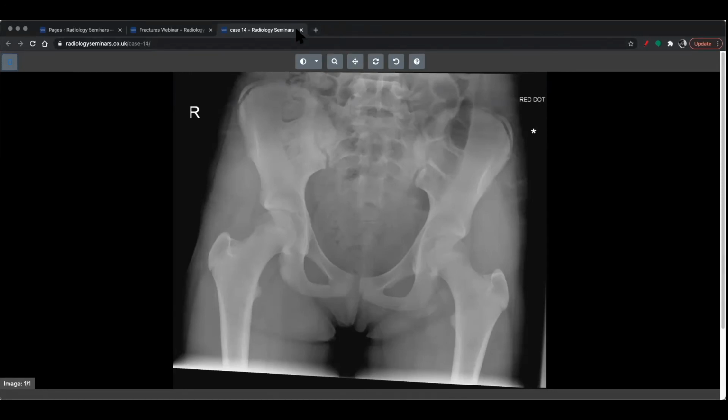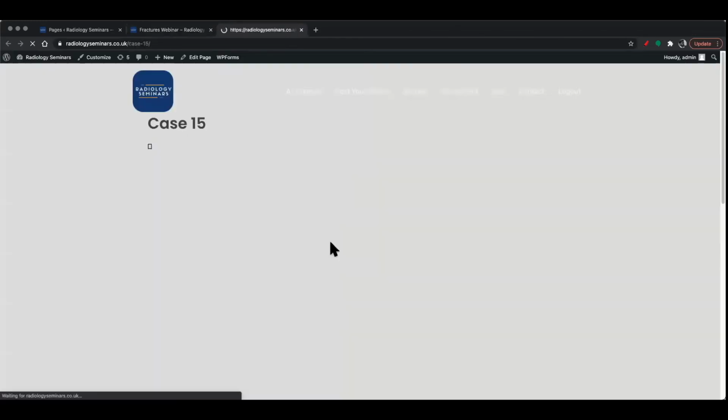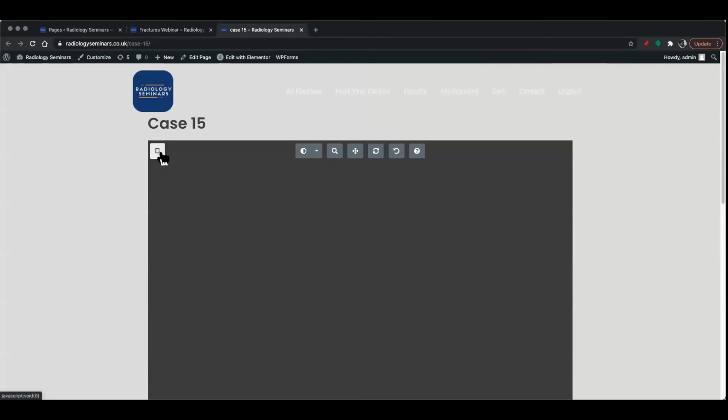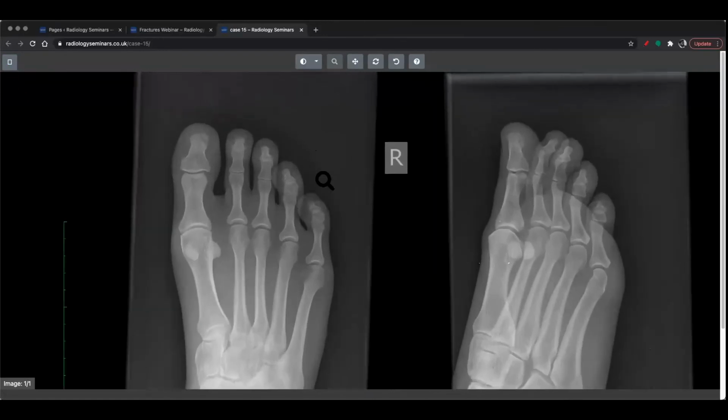So this is something that can happen to very young people, and so just something to be aware of. Look at those normal, very high yield areas: anterior inferior iliac spine, anterior superior iliac spine, and then look at the ischial tuberosity as well. So well done. A few people did get this. This can be a bit challenging. So feel free, if you have seen it, to write down what you think. For those of you that haven't seen it, don't worry, we're going to go through it using a system.